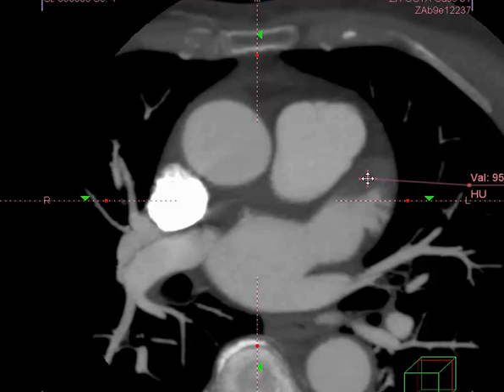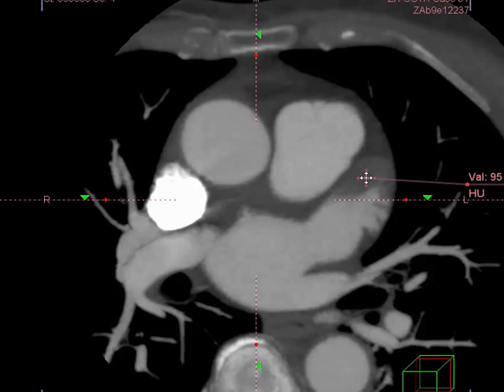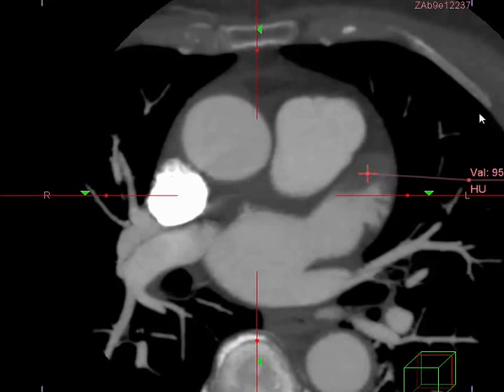So very slow flow in patients who have atrial fibrillation, and frequently if we took the images maybe 5 or 10 seconds later, we would actually see this area fill in with contrast. So this is what's called a pseudothrombus. If this is of concern, then the patient probably should have a transesophageal echocardiogram. But in this particular case, there clearly is some flow into that area, so it's not absolutely a thrombus, but you remain with some difficulty in the clinical situation.